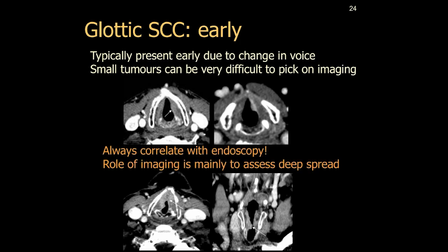It is therefore important to always correlate these cases, particularly of the small lesions, with endoscopy, as these tumors can be easily missed on imaging. And remember, the role of imaging is mainly to assess for deep spread. The small mucosal lesions can be better picked up on endoscopy.